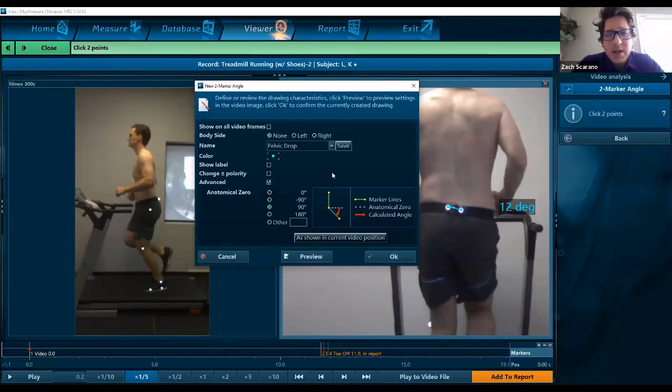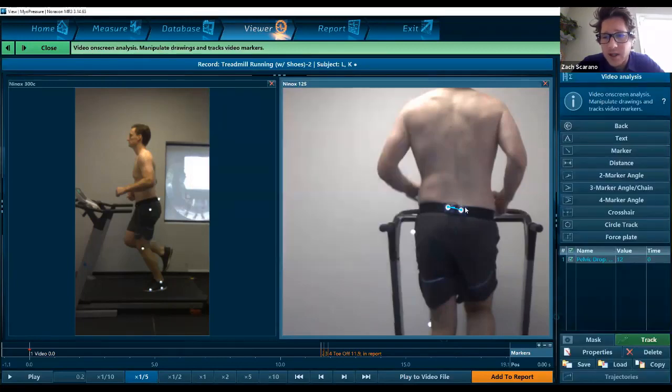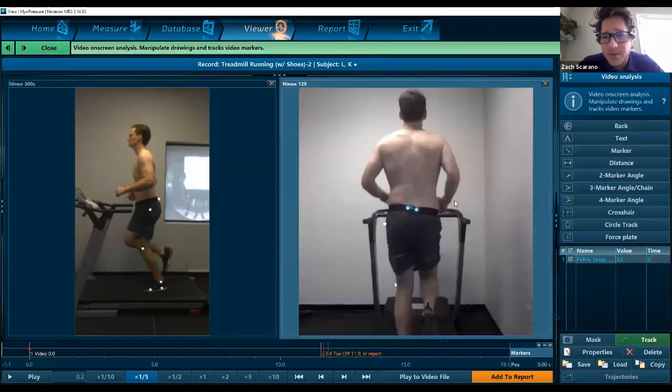Of course, as you start using this and determining what drawings you actually want to provide on certain analyses that you might be completing, it really is just that first part of effort to get it set up, and then these things will be accessible to you going forward. Once that's established though, you can click OK and it'll save that drawing in the frame here.